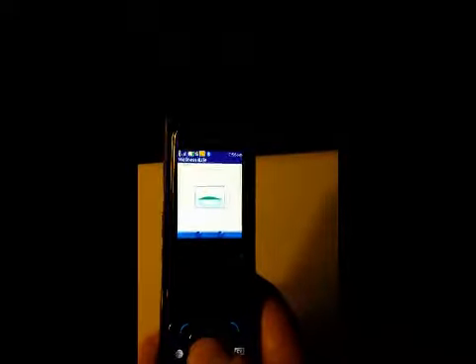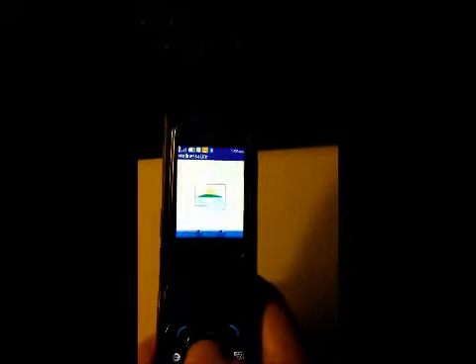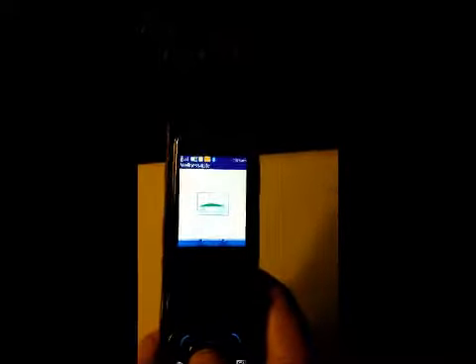Next, and it's now going to verify that I am in fact the user of that account, and then it will download. There we go, that's my account number. It is now done, and it's going now to download and configure some of the icons that go on this feature phone desktop, as we would call it.